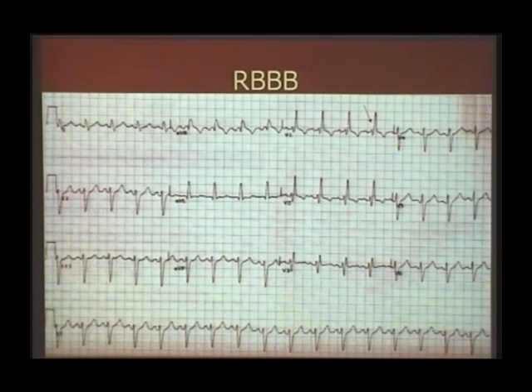Because the depolarization is delayed, you have secondary ST-T changes producing the ST segment and T wave. The concept is that wherever the bundle is blocked to a particular ventricle, that ventricle is activated last, and it is activated through the muscle. So the last vector will come towards the ventricle for which the bundle is blocked. If the right bundle is blocked, the last vector will come towards the right side. That is the last ventricle to be activated, and it will come through the muscle. So this results in a terminal delayed positivity over V1, negativity in V5, V6, and secondary ST-T changes.